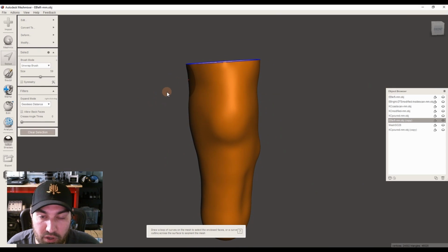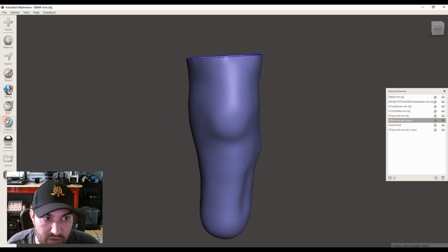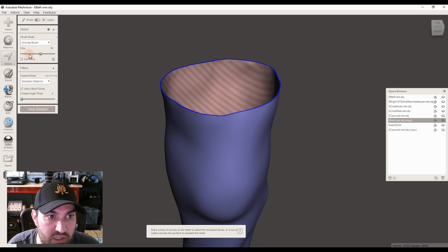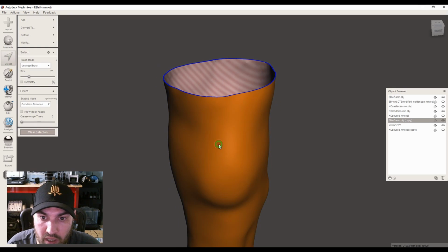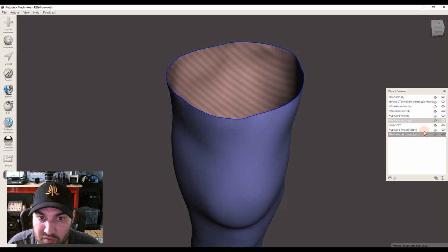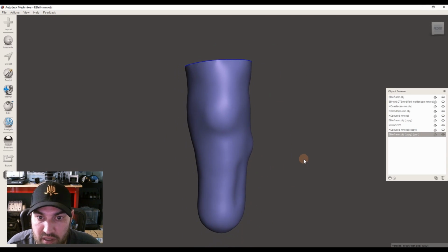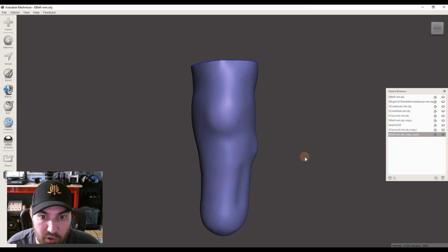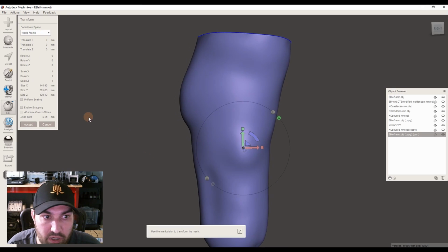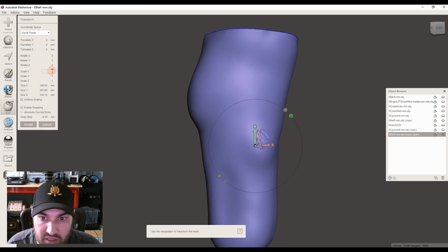You can go bigger, or you could go minus 0.5 to go 2-ply smaller, and then that would give you that. So if you hit escape before you separate, you can always just select, double click, edit, and then separate it after the fact. So that is one last thing you can do there for volume change, in addition to edit, transform, and then you could always scale.